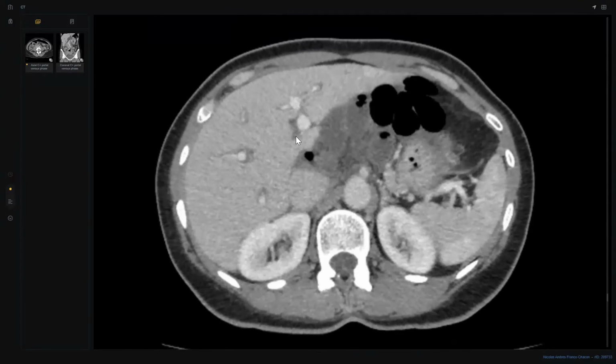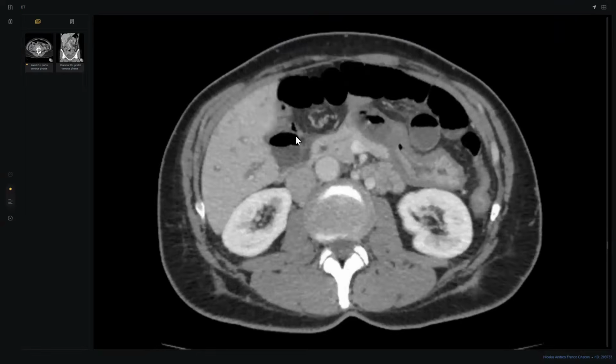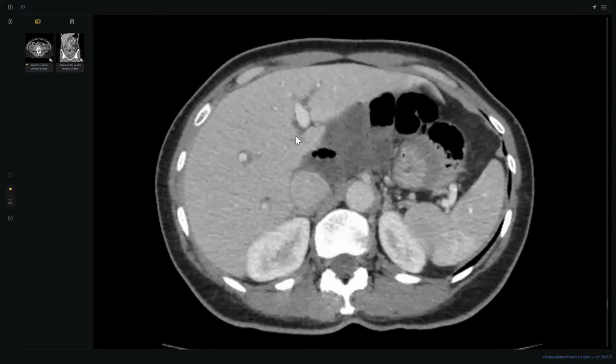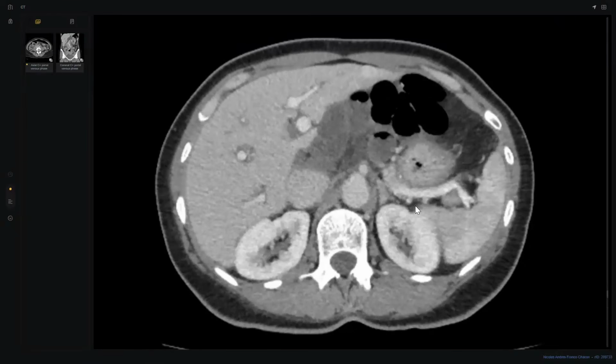First, I thought it's a lesser sac, foramen of Winslow hernia. You are correct. Where is the bowel? In the lesser sac. I can see them anterior to the stomach mainly. Are you sure? What is this? This is the stomach. Follow it. So what's your final diagnosis? This is a strangulated lesser sac internal hernia through the foramen of Winslow. Need urgent surgical referral.